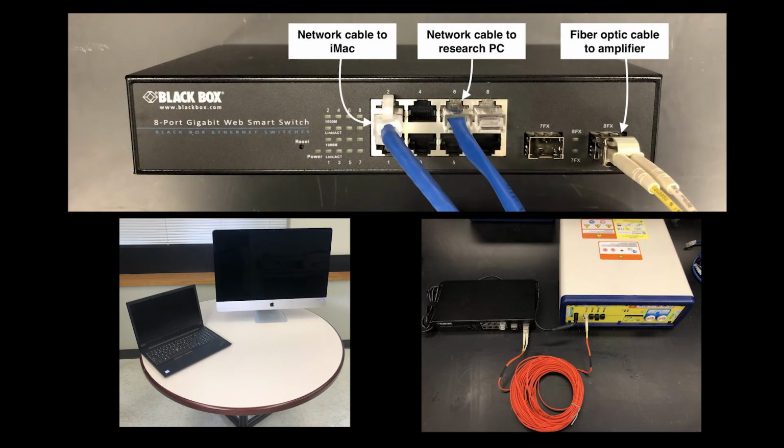Then we will connect the network cables to the EGI iMac, which plug into the back of the computer, and then connect the other end to any one of the 8 ports on the switch box. Lastly, connect your other network cable to your BCI2000 PC, and then to the switch box. After doing this, your network switching box should have 3 cables plugged in, as shown in the current image.